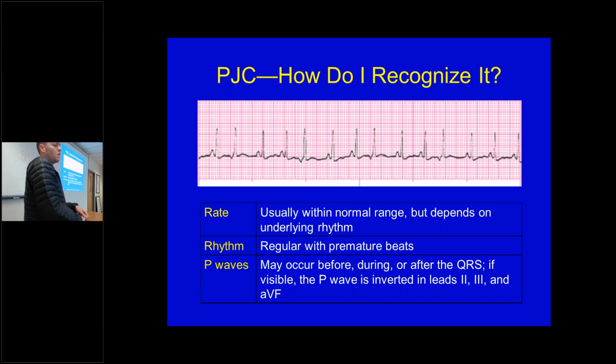All right, so your rhythm, can you tell that it's regular? I mean, at first glance, unless you really looked at it hard, it would just look irregular, right?